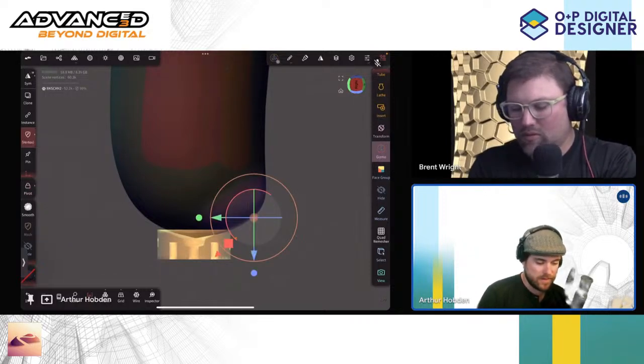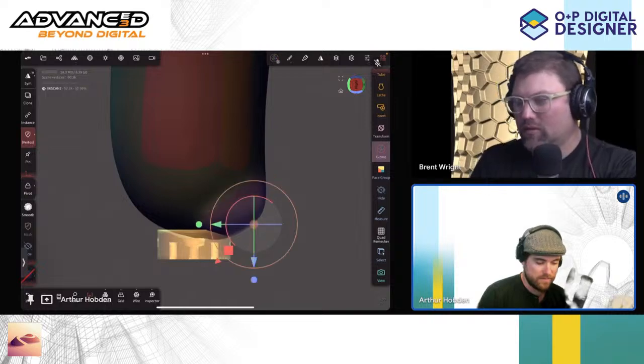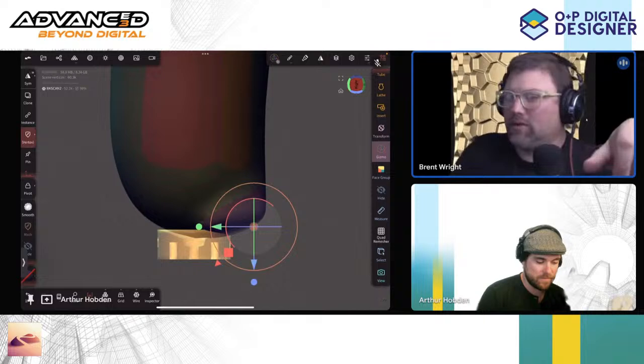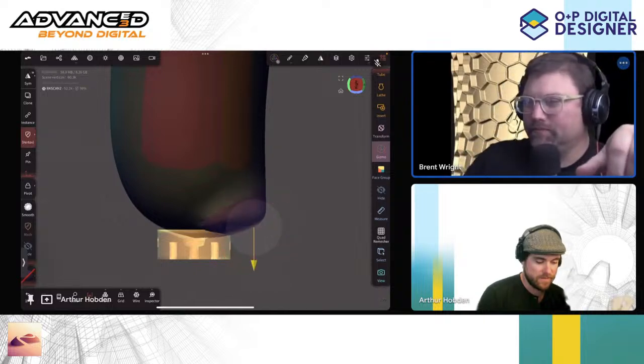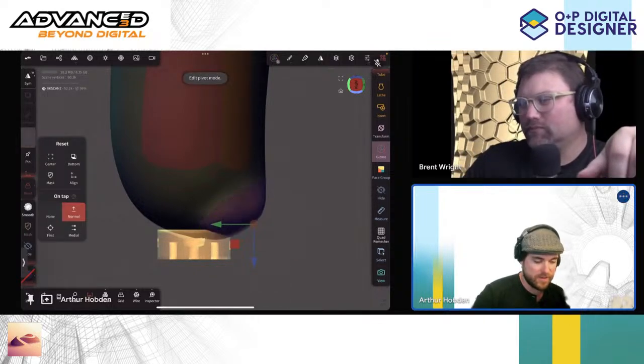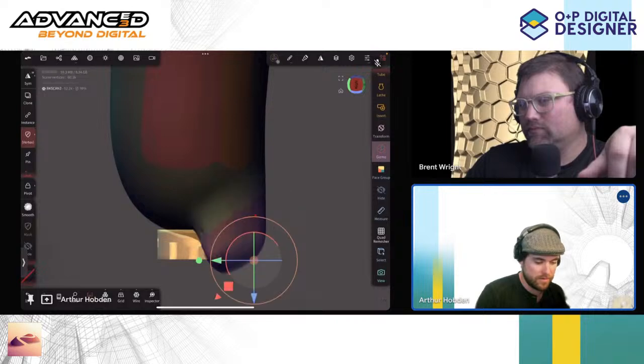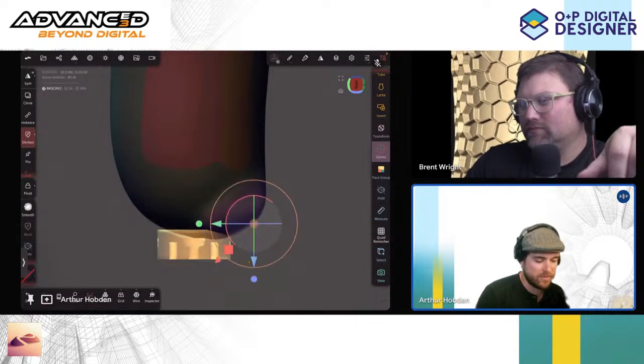And so you were saying it kind of goes down a bit, and if I try to use that one-dimensional scale, it's coming down and flattening a bit. Yeah. That's pretty slick. And the best part about modifications is that we can double tap any of these handles to give it a reading or a measurement. So if I go 1 millimeter, that is not 1 millimeter. I wonder, oh, it must be in inches or something. So let's go down.